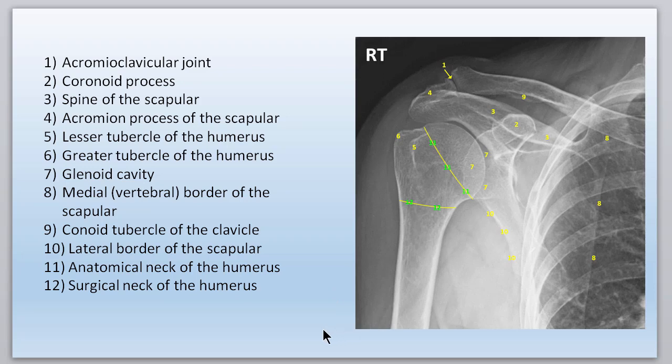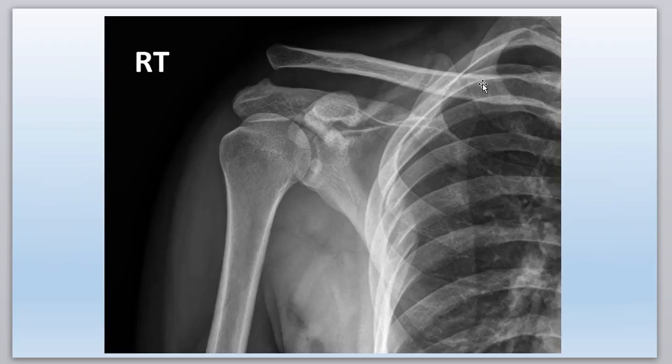And alright, let's just check in to make sure. Did I go over that little 9 structure right there? Conoid tubercle. That's probably the hardest one. The acromioclavicular joint, which has a ligament over it, right? Acromioclavicular ligament. I don't think that was on our list, but it really should be on our list because it's one of the key ligaments that blows out during AC sprain. Okay, let's move to the next one.